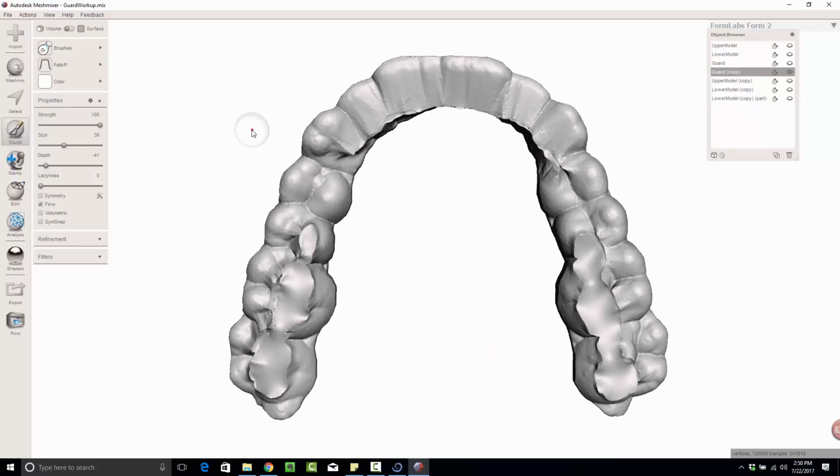So one last thing is, well, we've got our guard made. I'm going to hit Control S to save this. Well, and actually, there's a little tip. If you look, you see my little red dot, how it's going back and forth on both sides of the screen, and there's this white line.